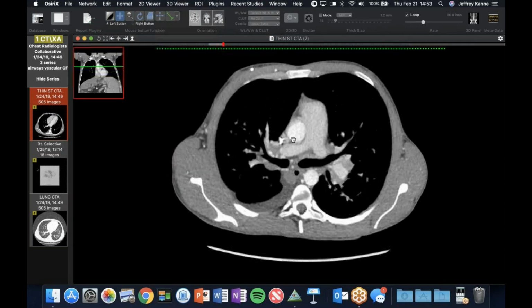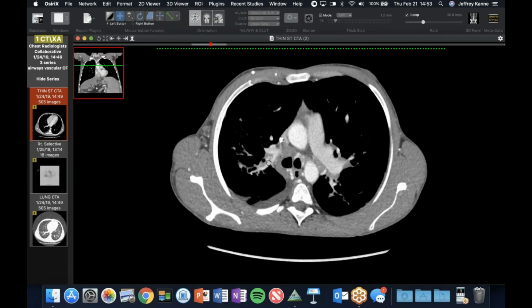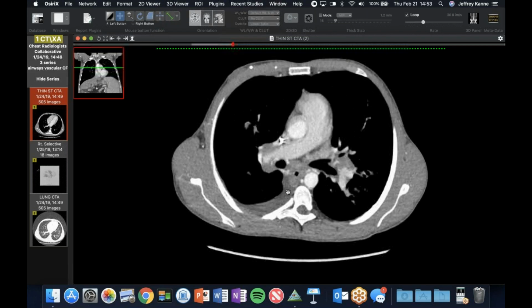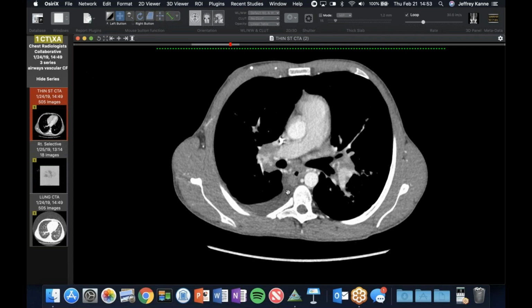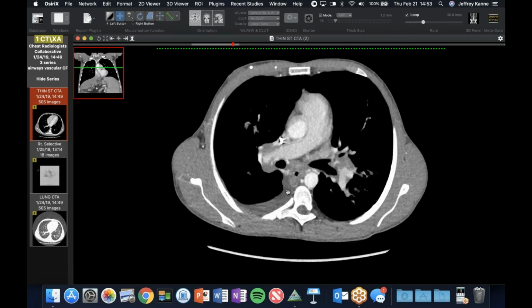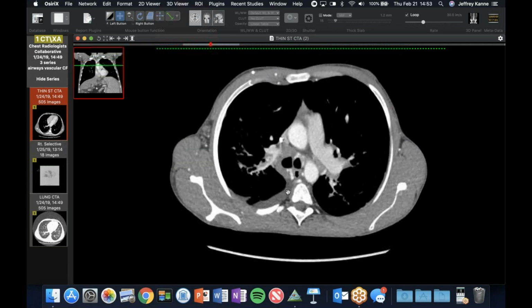and I've even got an angiogram. The reason they did this scan was the patient was having hemoptysis, and it's rare, if ever, that you see much. There's maybe a little blush right there, but usually the CT doesn't help very much, because they either have massive hemoptysis and the radiograph gives you a hint of where it's coming from, but you don't see the active bleeding. But these are just big, juicy bronchial arteries.